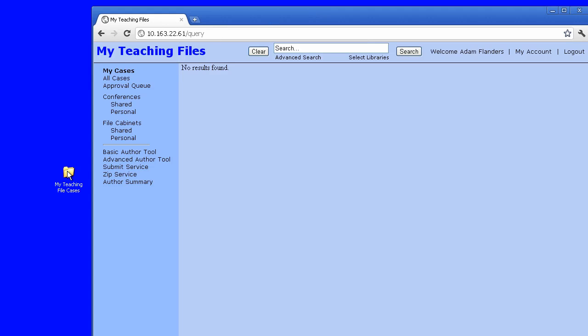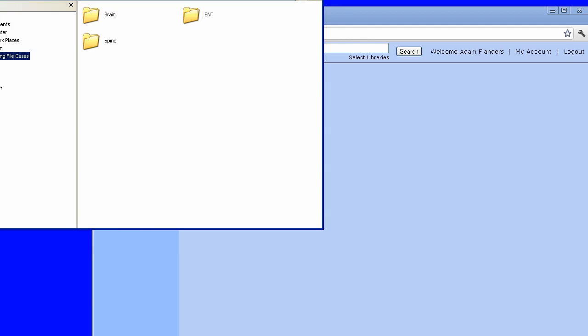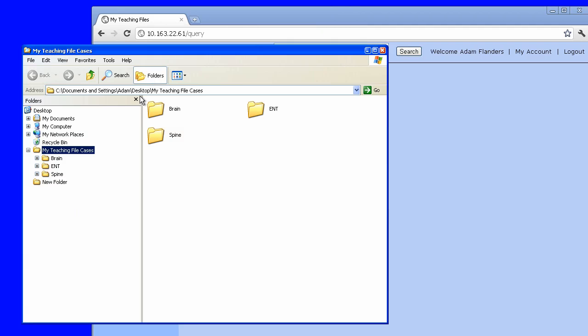And what a lot of people have done is basically in their daily clinical work maintain a folder with a lot of nested subfolders inside of it with a lot of interesting images that they may grab during a clinical day, save it on their desktop, maybe put it on a USB stick, keep it in their pocket, and as they work every day, maybe save a few images in there. And I'll show you what I kind of mean. Here's a little sample where you basically might keep a large folder.